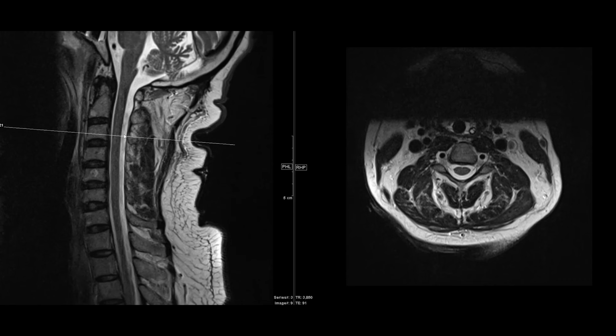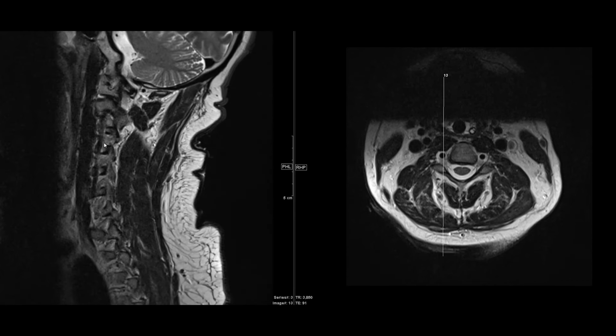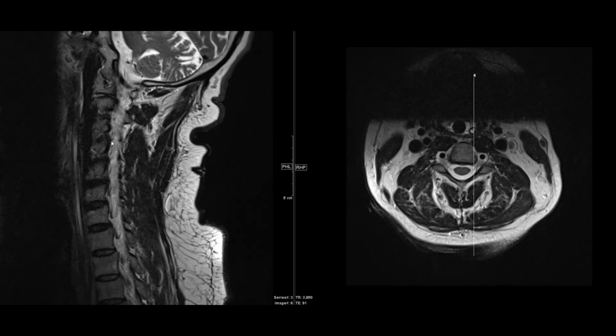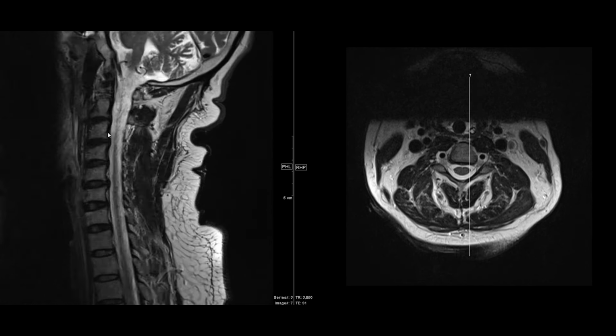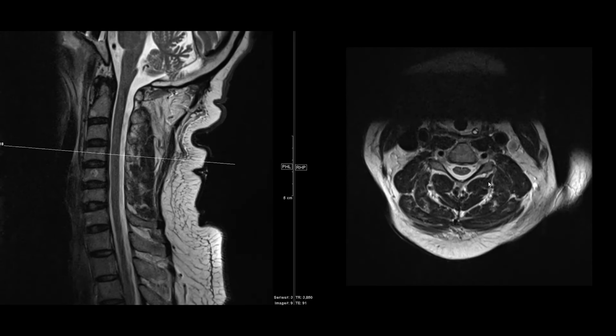Now you can also sometimes take your sagittals and scroll out a little bit to the side, and you can see the neural foramen where the nerve root is exiting, but it's much harder to see on the cervical spine than it is on the lumbar spine, just because of the angle. Here again, you see the nerve root, little dorsal ganglion there coming out, surrounded by fat. So you can see that there. And what you're going to do is you're going to go down and continue to scroll through.